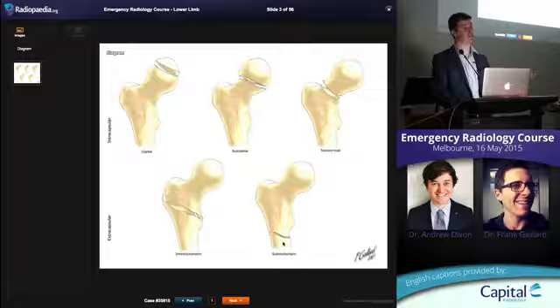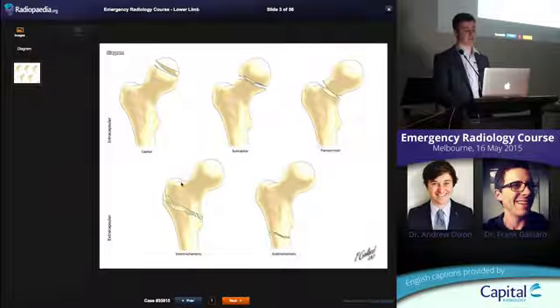Same with the scaphoid. This is a case of, are they going to develop avascular necrosis or not? The hip joint capsule inserts right down here, basically where that shading is. That's where the hip joint capsule is going to insert. All the vessels come through at that level and fire up to supply the head.